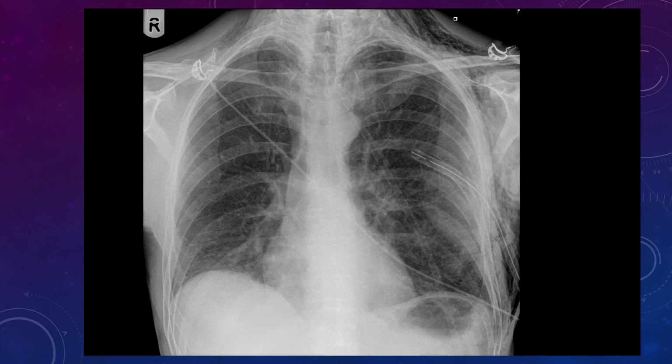You might have an AP C-spine with some surgical emphysema. Where's it come from? Why have we got it in? Have they not got a chest drain in? If they've not got a chest drain in, why have they got surgical emphysema? They might have been vomiting a lot.